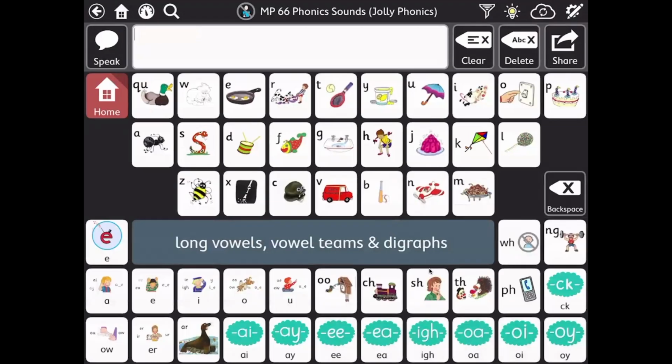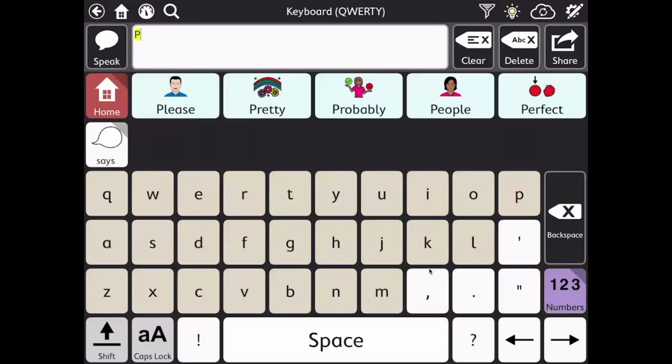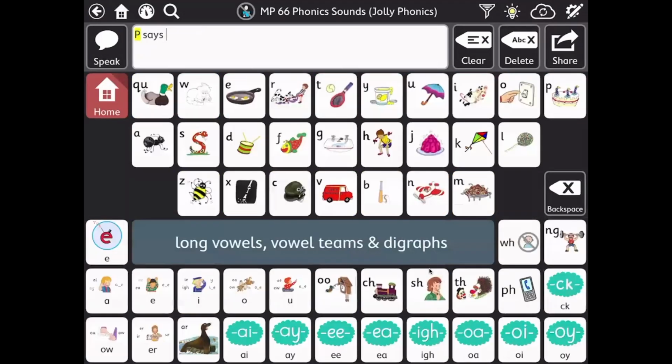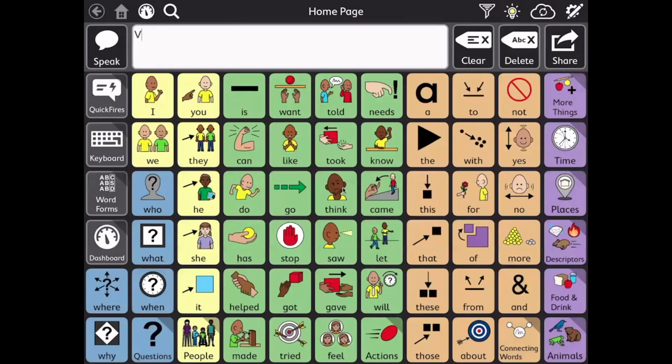Oops. That was not great. But let's see, let's listen to it again. And I wonder if we said the whole thing. I thought it might say the P at the end, but it doesn't speak that out. But that's okay. Each of these have a sound to them. So it is great instead of just saying the letter name.